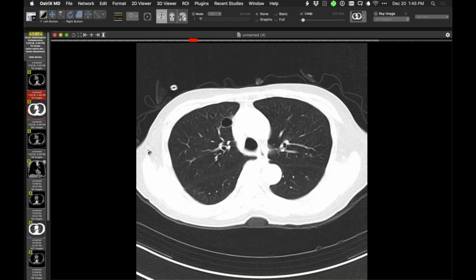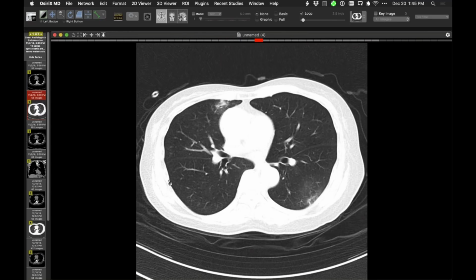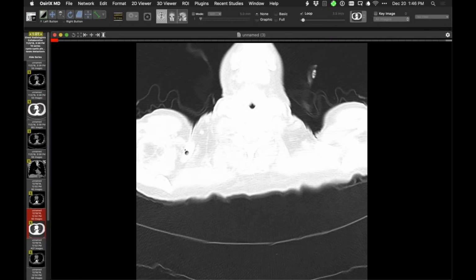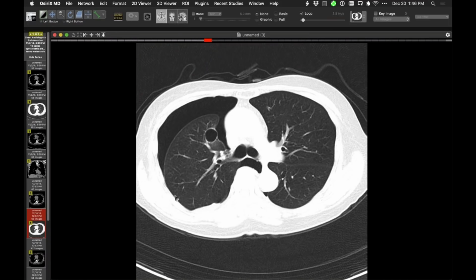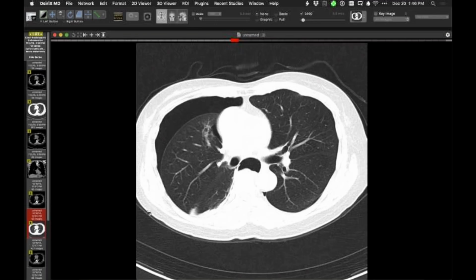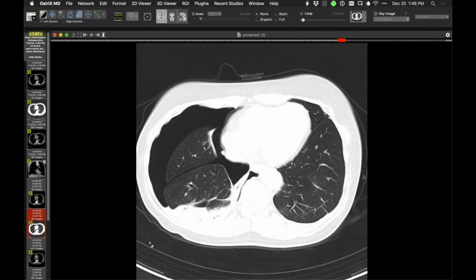around it. Here is another cystic space. Here is another lesion. Okay. So this patient does have a history of a post-auricular cutaneous angiosarcoma. So these imaging findings are very consistent with the cystic lesions of metastatic angiosarcoma of skin. And undoubtedly one of these cystic lesions, perhaps this one that's really close to the pleural space, disrupted the visceral pleura, resulting in pneumothorax.